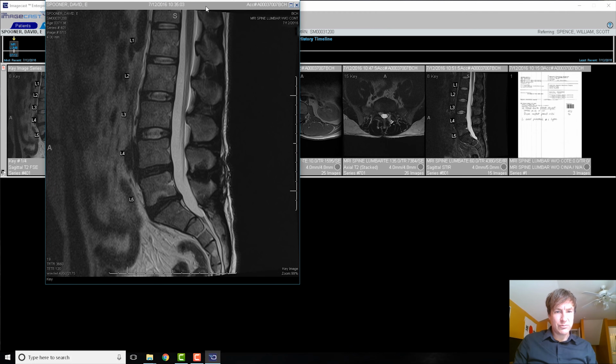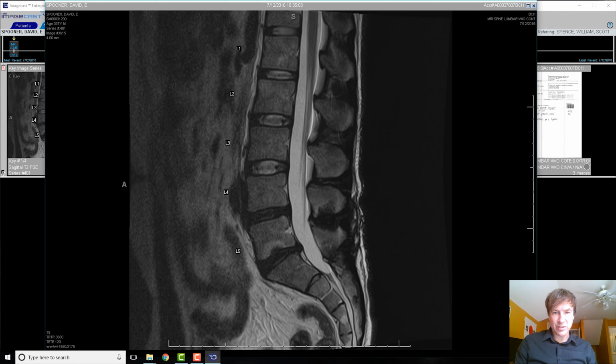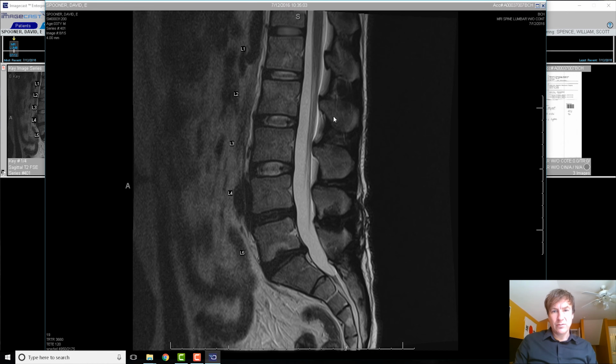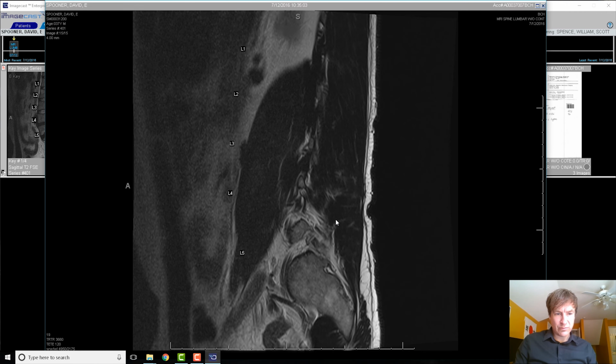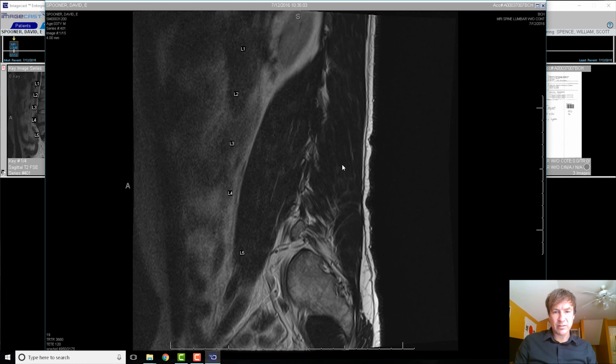So this was right before, like a month before they did the stem cell injection. Again, I had not gotten a contrast on this, no contrast. So we'll start, let me figure out where I'm at here. Okay, so I believe this is the right side.